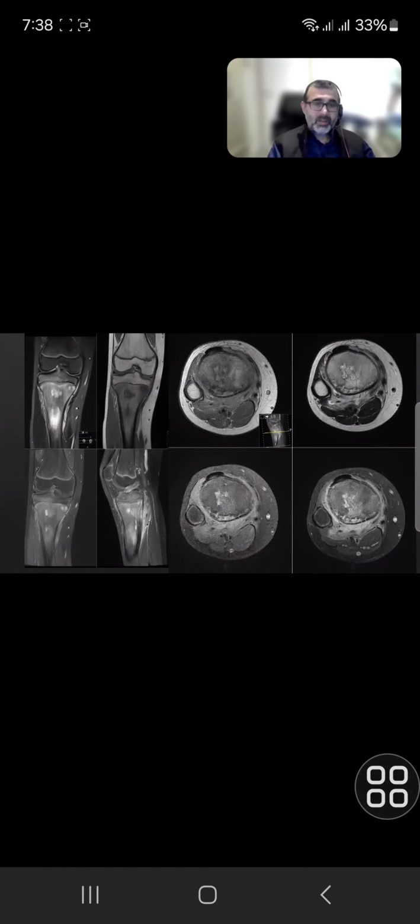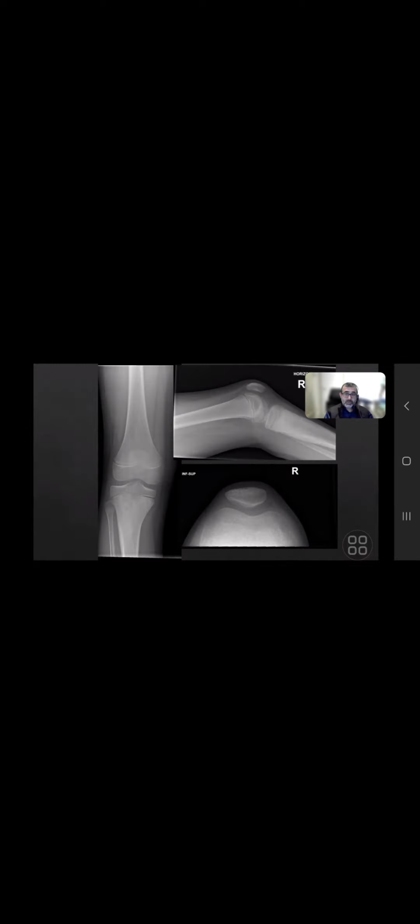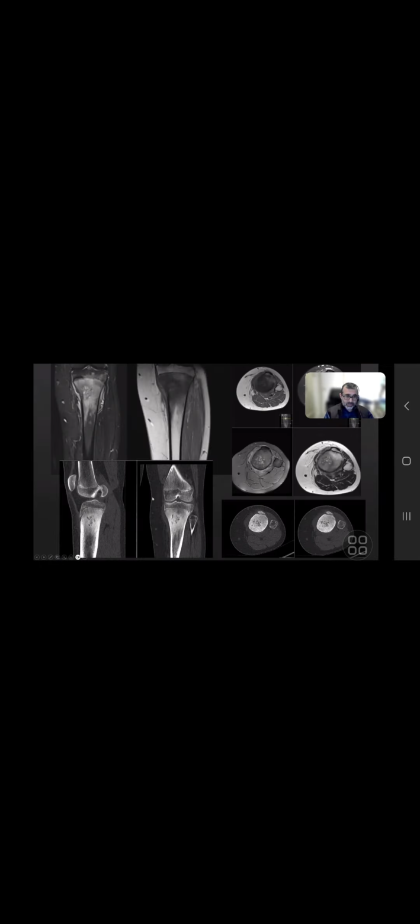with the CRMO. So that's how it can present with a lot of sclerosis, just like this over here. And another patient, 15-year-old, persisting pain in the left knee. Again, you see this sclerosis, and that was also similar to the other patient, diagnosed as CRMO.